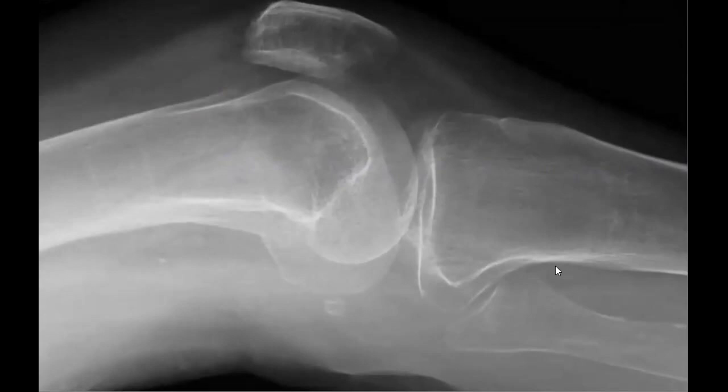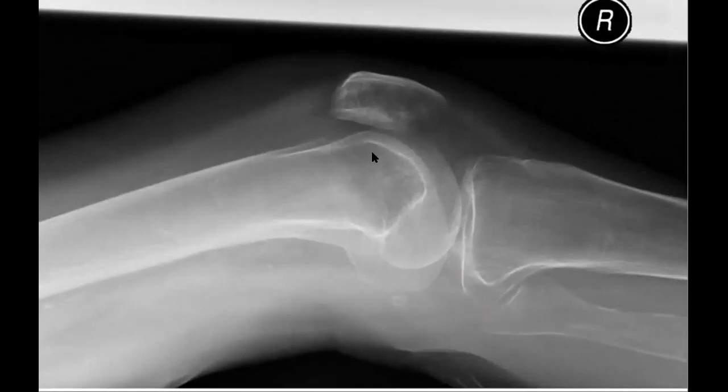So Maya is okay. Inshallah, we can try to every time, inshallah, we can try to make some training. Yeah, the fracture is here. Very lucent, subtle one, but is present. Rabab, thank you.